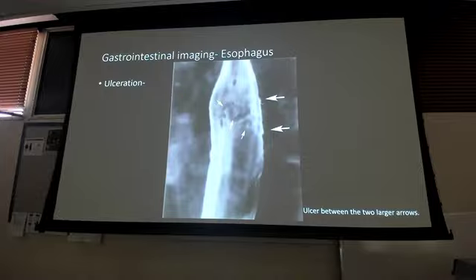You can see on the line, it's not necessarily smooth, it's kind of hazy and a little polka dotty and choppy there. That's going to be my ulceration. Just know that ulcerations of the esophagus, although rare, are a possibility. The radiologist is going to pull that out more than I would expect you guys to, but it's one of the abnormalities that's there.